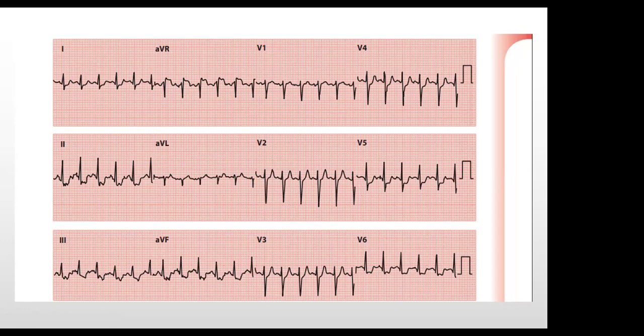So the heart may be having some form of hypoperfusion from the fast heart rate as a result of impaired diastolic function. What do you think? Any comments on this?